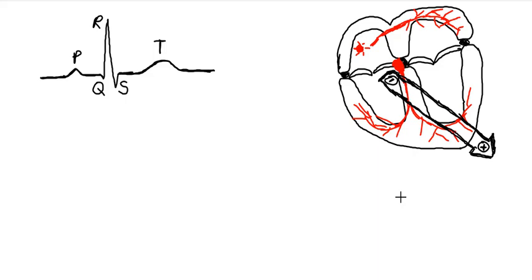In the last lecture, we talked about what different ECG waves represent and how to differentiate between them on the real ECG. In today's lecture, we are going to talk about how different ECG waves are formed, why some of the ECG waves are positive and some are negative, and we will also talk about different ECG segments, different ECG intervals, their durations, and at the end we will have some practice on the real ECG.